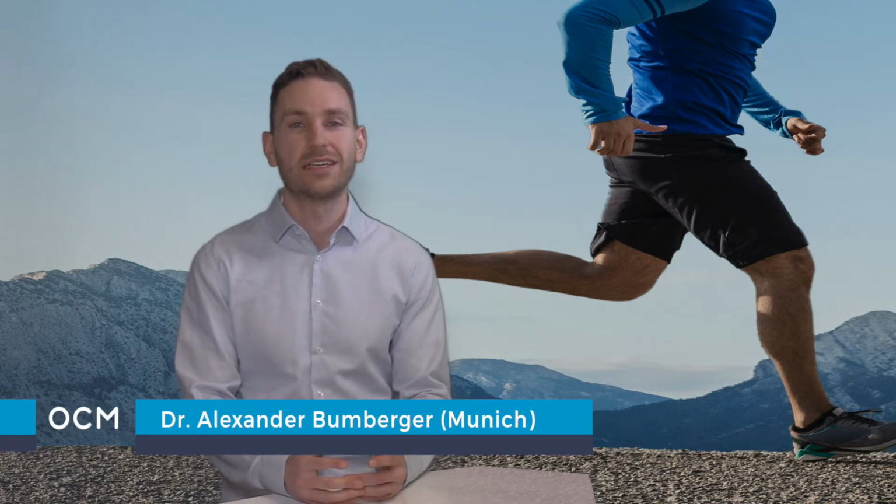Torsional deformity of the lower limb can be an underlying cause for patellofemoral instability and should be assessed if there are clinical signs of maltorsion. As the analysis of rotational or torsional deformity can pose a difficult endeavor if not performed on a regular basis, we would like to show you a simple way to analyze it on CT or MRI using standard PACS tools.